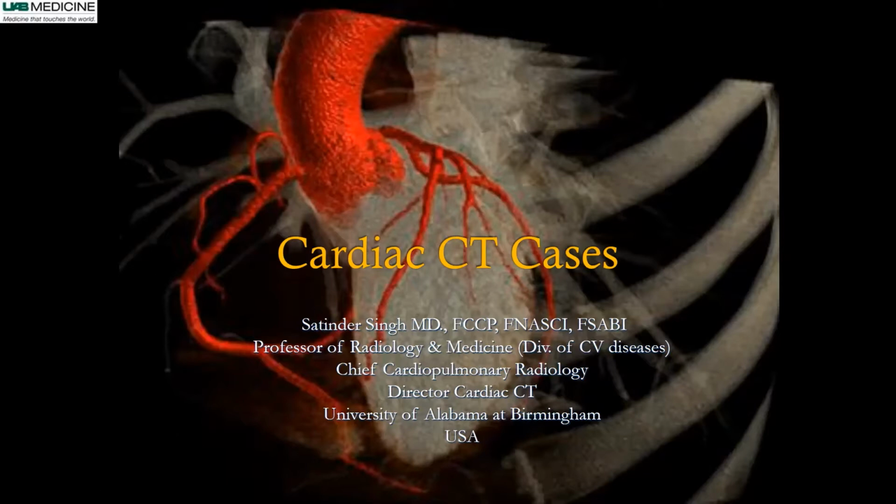Well, we did a podcast on cardiac CT, and we thought it would be important that beyond the discussion, we would share some images because it's about cardiac imaging, really. First, Dr. Singh is going to talk about the calcium score. We talked about the importance of the calcium score and how it helps us decide whether the patient should be treated with certain medication or not, and it gives us an idea about prognosis.